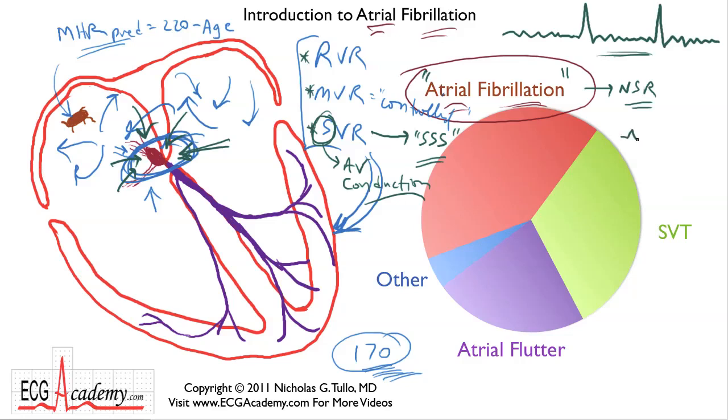Now and then, the atrial fibrillation can become very coarse. We refer to atrial fibrillatory waves that are very large as coarse atrial fibrillation. And sometimes they can get so big that it almost looks like a P wave because it coincidentally lands in front of a QRS complex. But you have to make sure that if you're seeing what you think are P waves, they're consistent in front of every beat. Those are just a few important considerations.